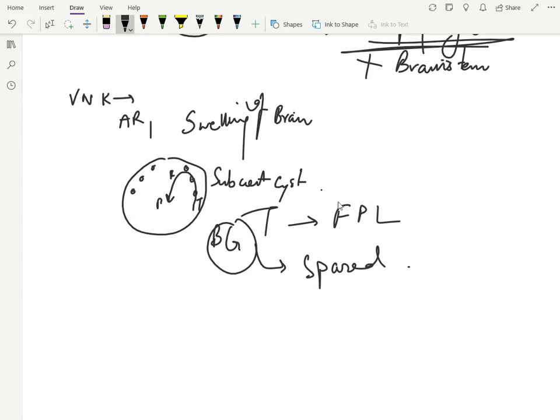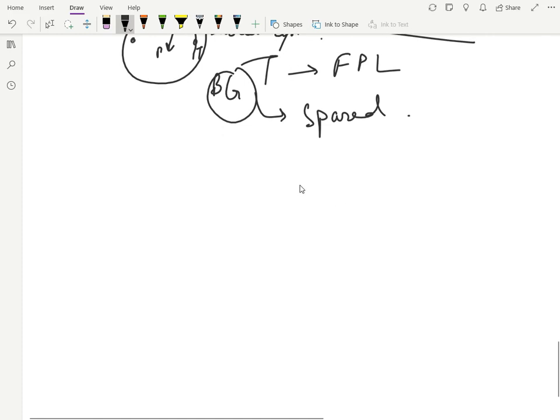And as you can see, there will be cyst involvement, and therefore the head size is enlarged due to the swelling of the brain and cysts. There's enlargement of the head size, and slowly, the symptoms begin at a later date than other leukodystrophies. It's a slowly progressive disease, and the cysts expand the gyri. So that's why you have the swelling of the brain.